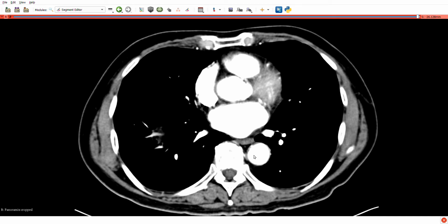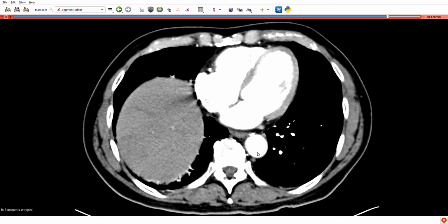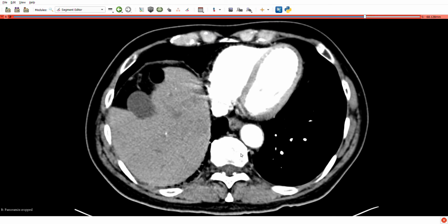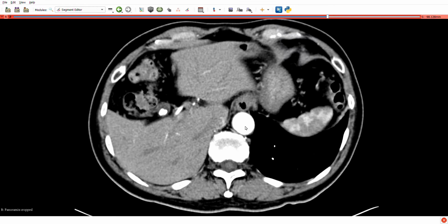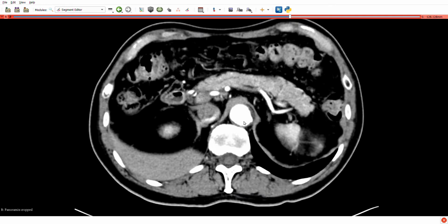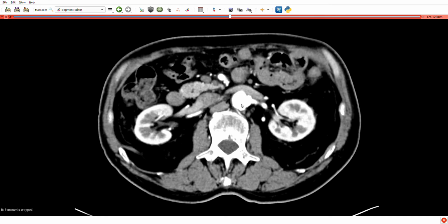The first thing that we'll do is we'll follow the aorta down. So just keep your eye here on the aorta on the left-hand side. So we're following it down now. You can see it remains on the left, closely applied to the spine, gradually becoming more anterior. And as we enter the abdomen, we start to see some branches emanating from it.